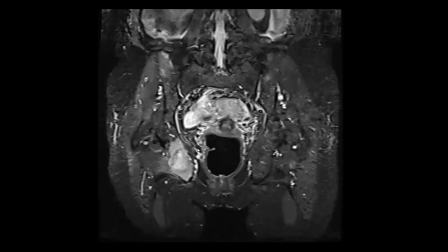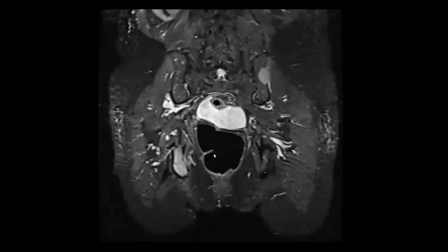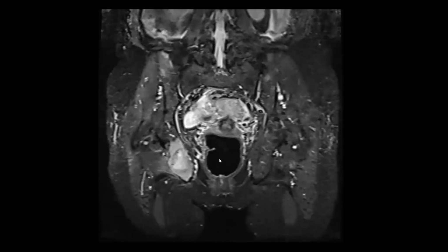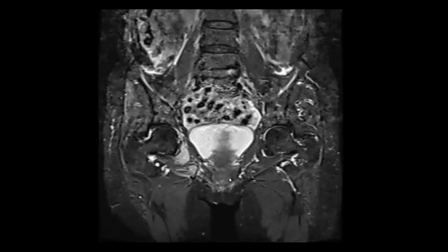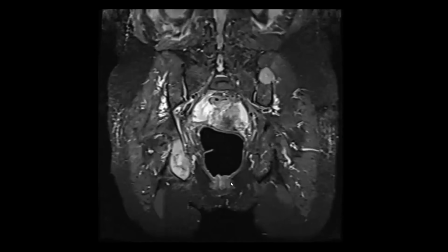Any other lesion beside this? Just leave this lesion. Any other thing? If not, then conclude the case for me. Any other lesion beside this lesion? I'm just looking for the rest of the scan. To me, no definitive additional lesions could be identified.